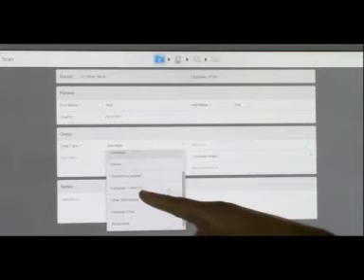Then you've got Invisalign Plus iRecord, and this is the one I suggest you use the majority of the time, because it gives you a closed Invisalign file and an open STL file in one scan. So if you needed, for any reason, to do wires and brackets or send something else to your lab, you've got both types of scans in one scan.